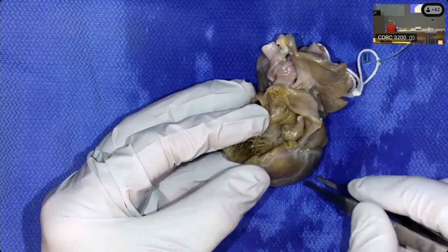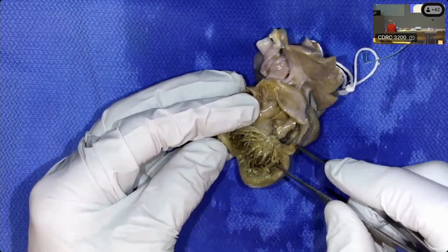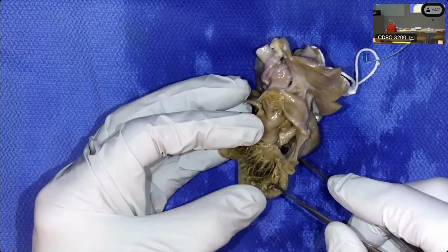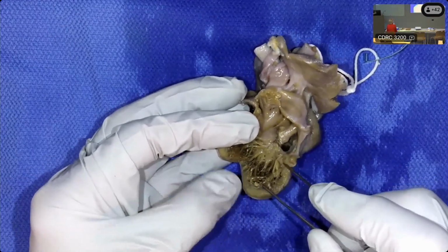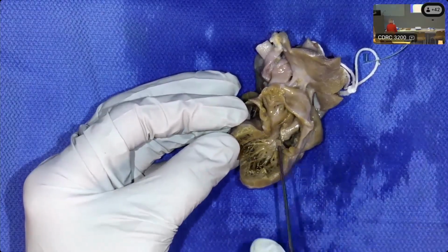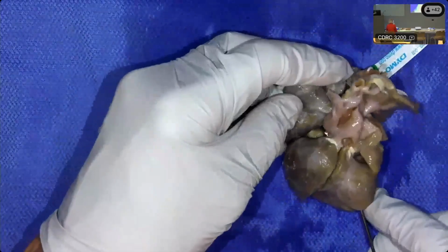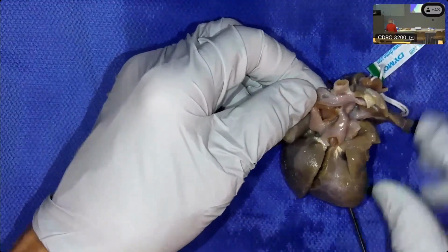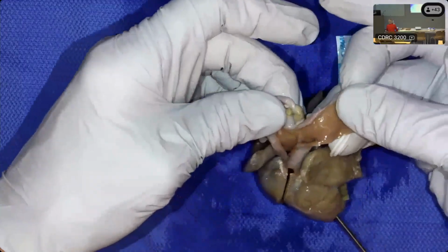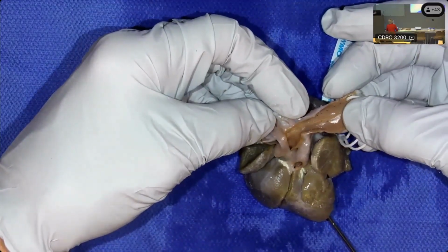And on this left side, we can appreciate a smooth vestibule. There is the left-sided left ventricle with some increased trabeculations, but not as remarkable as the right side. And the aorta did come from the left ventricle with a left arch and a widely patent arch.